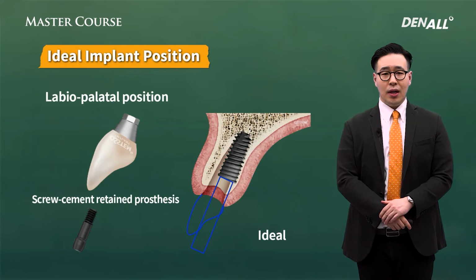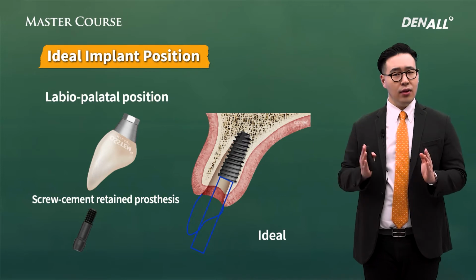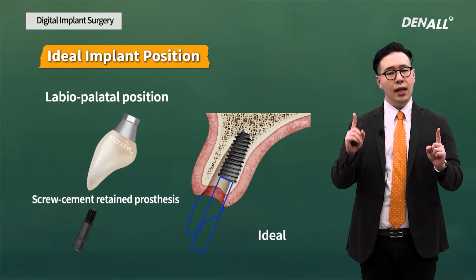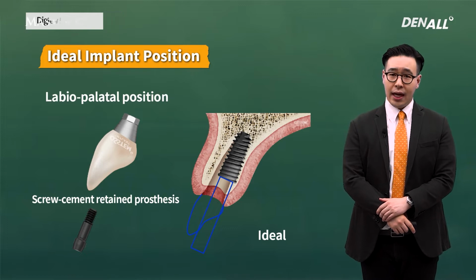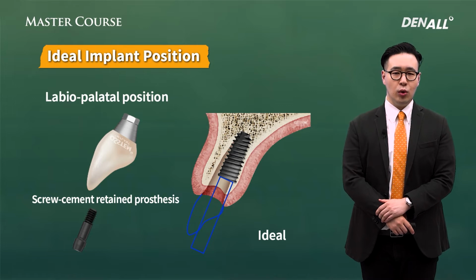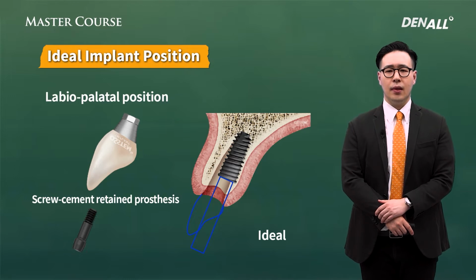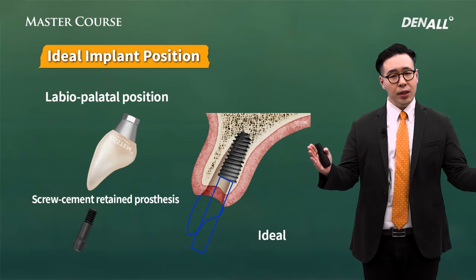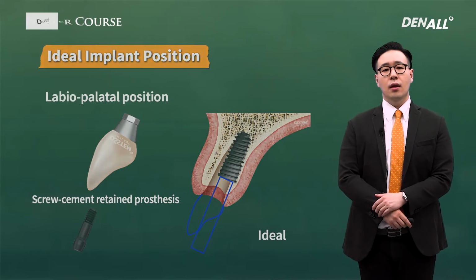However, as you can see, if you use guided surgery, on the program, after the final prosthesis appearance is rendered, ideal positions in terms of prosthesis and surgery can be visualized. And if they do not merge properly, the final implant positions can be determined in the next best positions. So much more precise treatment planning is possible. Surgery can be done accurately and fast. Before surgery, a temporary prosthesis can be prefabricated. That's like killing 3 birds with 1 stone.